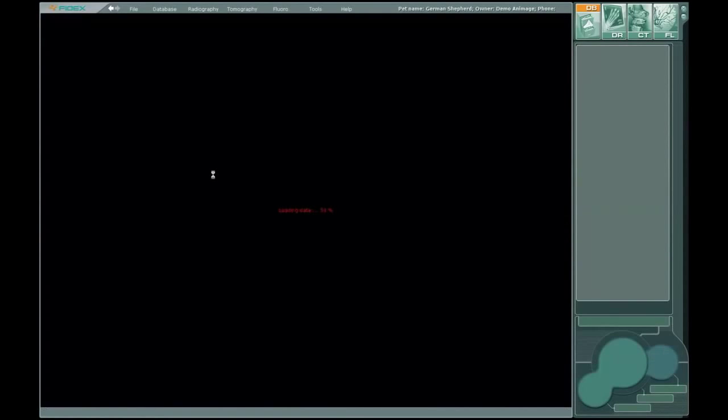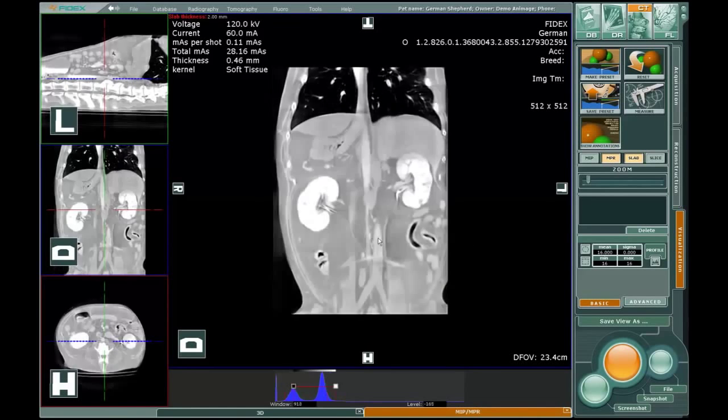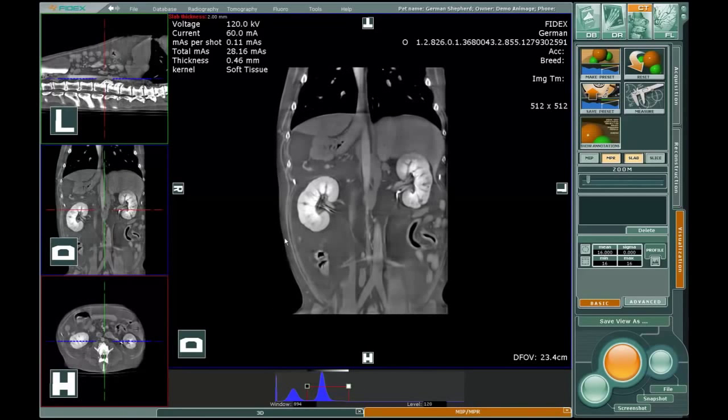The software is now in CT visualization MIP/MPR mode. The study will open with a coronal cut in the main window. The other orthogonal cuts are shown in the 3 smaller windows on the left. Window level, contrast, brightness control with the right mouse button is the same as in DR and fluoroscopy. Alternatively, you can work on the histogram below the main window.